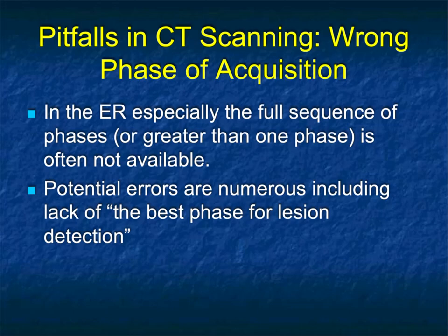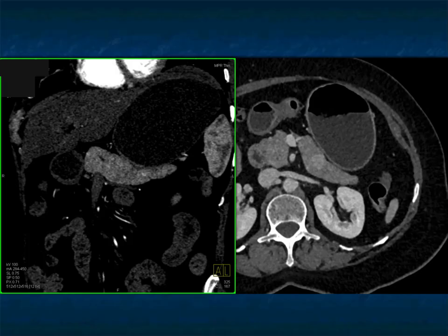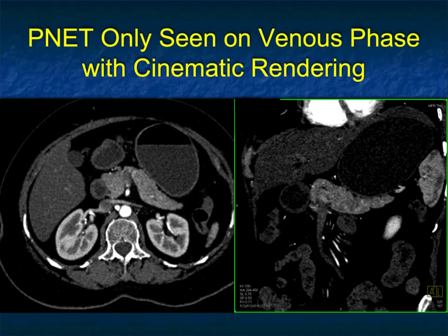Now, again, one of the challenges we know is the fact we have limited views. If radiation dose wasn't an issue, of course, we would have multiple views all the time. So it is always going to be a challenge for us. It's also important to look very carefully, right? So in this case, it was really hard to see the lesion. I'm showing you a few different images.